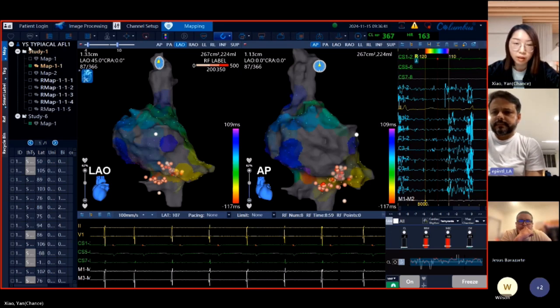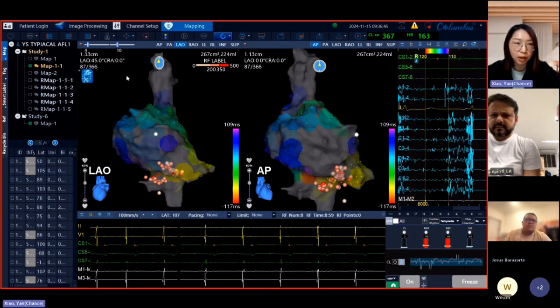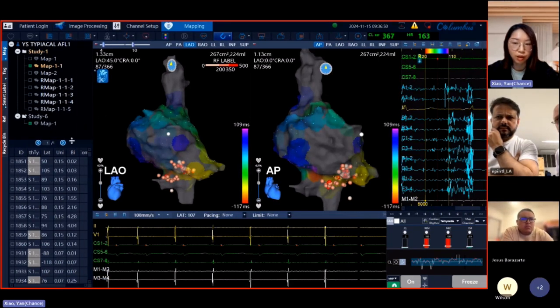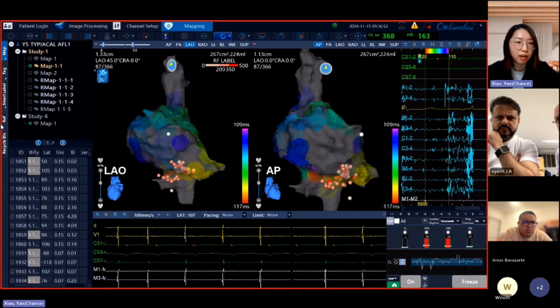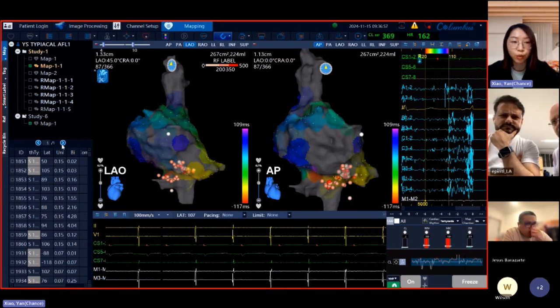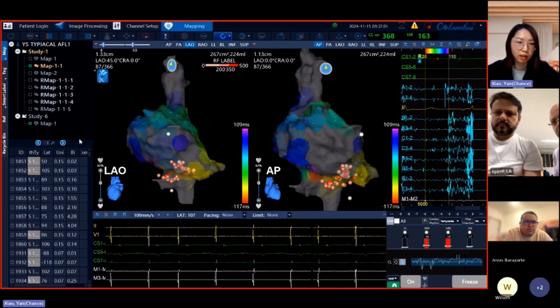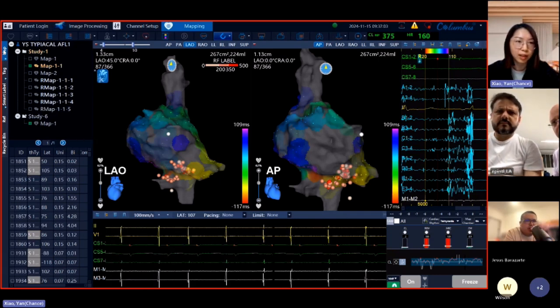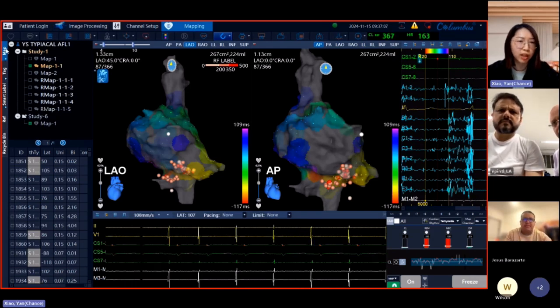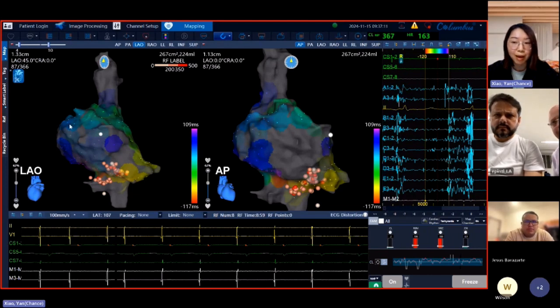Okay. Chance. Yeah. The second update is about the point list. On previous version, our point list is here: the map, the tag, smart label. But now we modified the point list bar. We put it on the left. It would be much more convenient, as we can leave more space for the map.